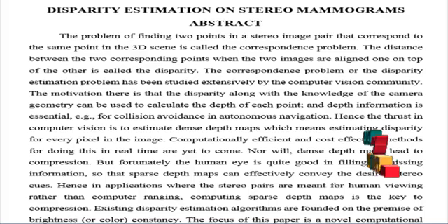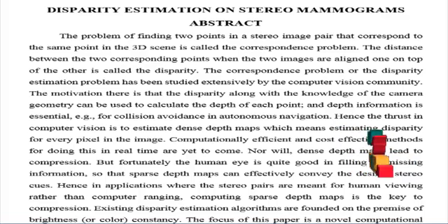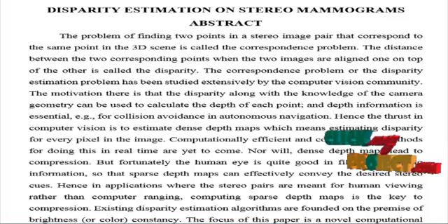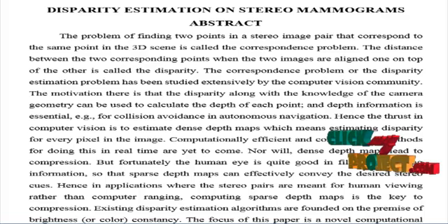Finally, the performance of the process is measured in terms of the bad pixel error measure. The process extracts a more exact disparity map from the stereo images, due to the exact identification of the stereo model from the images.